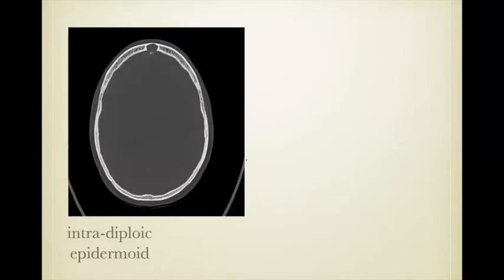Here's another hole. Here we see this lesion. You notice it's scalloped on the edges, and there's some bone that's been pushed out in this fashion. This appearance on the CT scan should argue against a metastatic lesion.